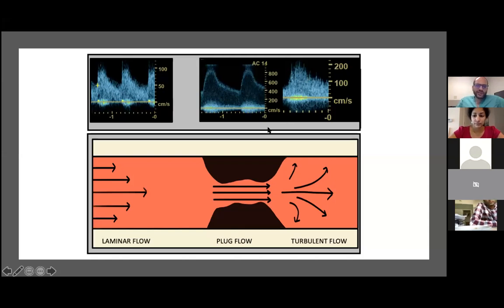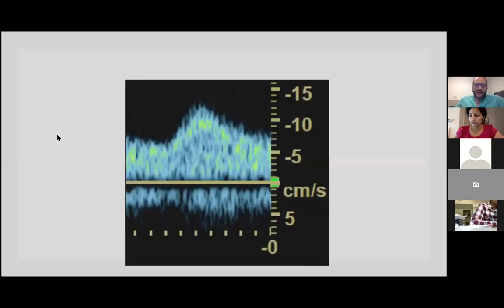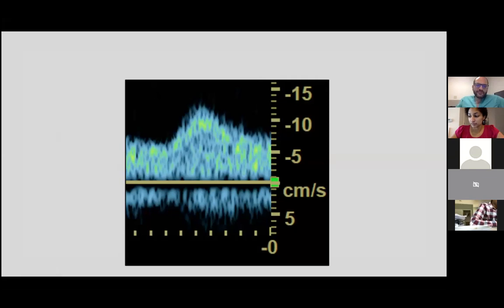So knowing this pattern is incredibly useful in looking at a stenosis. And this exists whether you're looking at a carotid artery stenosis, a renal artery stenosis. Any vascular stenosis is going to have a similar kind of waveform. The other thing you can get as well is, distal to a stenosis, you end up getting a parvus tardus waveform, which is defined as a delay in the reach to the peak systolic velocity. Typically, it's 0.1 seconds to peak is the definition of parvus tardus, and each one of these little hashtags is 0.1 seconds.